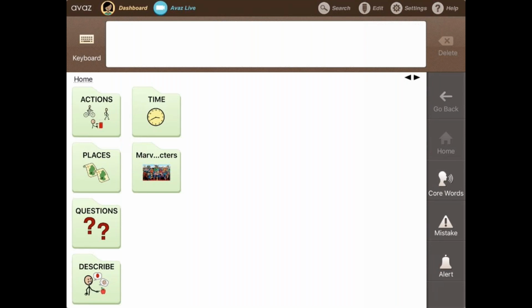All right, do we have any more questions? I'm glad to take any. Sure. So the question is from Mandy. If I can review one more time how to add a picture word from a folder to the home screen. Okay, so if I got this right, you're basically asking me if I can move a word previously.